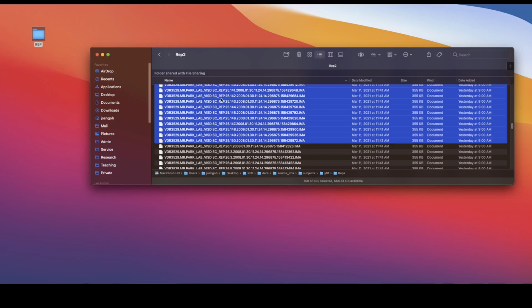This is because sometimes the subjects might have some error in the scans, and so they had to repeat some scans, or for whatever reason, they had to do some extra scans in between, so that maybe for a different subject, the rep2 or the second EPI run for that subject may not be sequence number 25. It may be sequence number 27 or 28 or 30, depending on how many sequences were done prior to acquiring this second run or whatever sequence at that time.